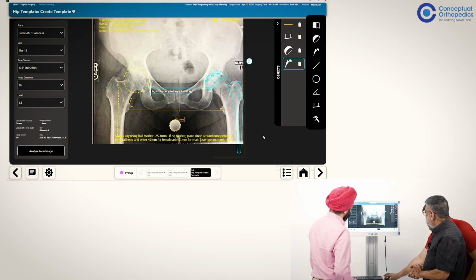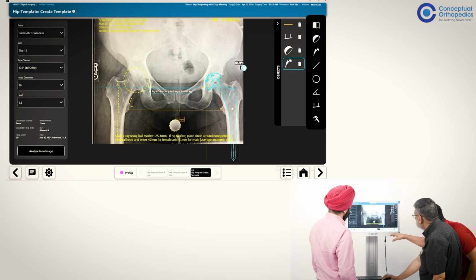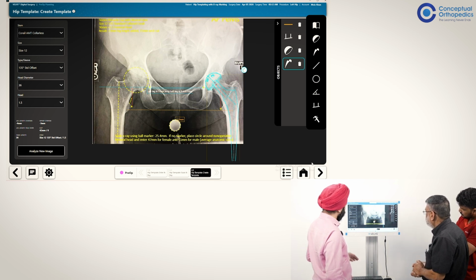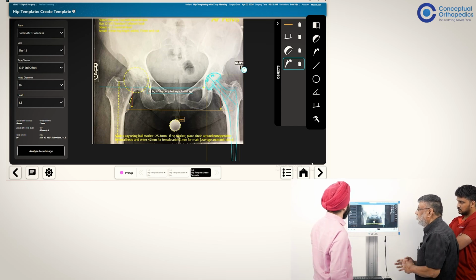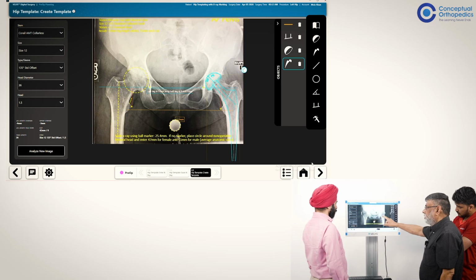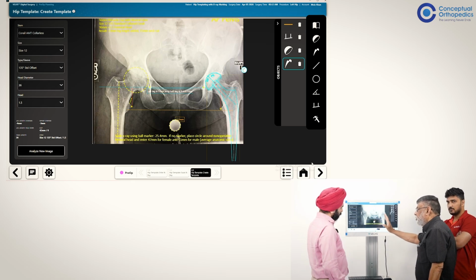So now say we get a stem which is not that close to it. So put the stem again and go a little down. Let's say the stem is coming here. What is this going to do to length? This will shorten. And the offset? Offset is almost similar, or maybe slightly shortened. So we don't want this, because it is already shortening there. We want to increase by 3 mm, and we want the offset to be not 0 but plus.